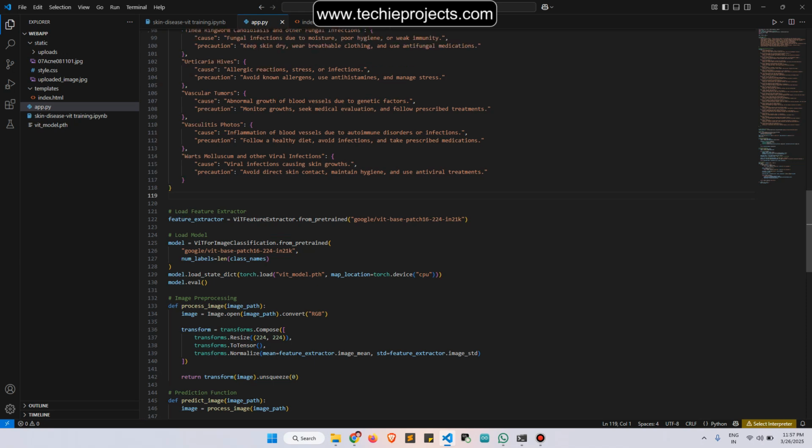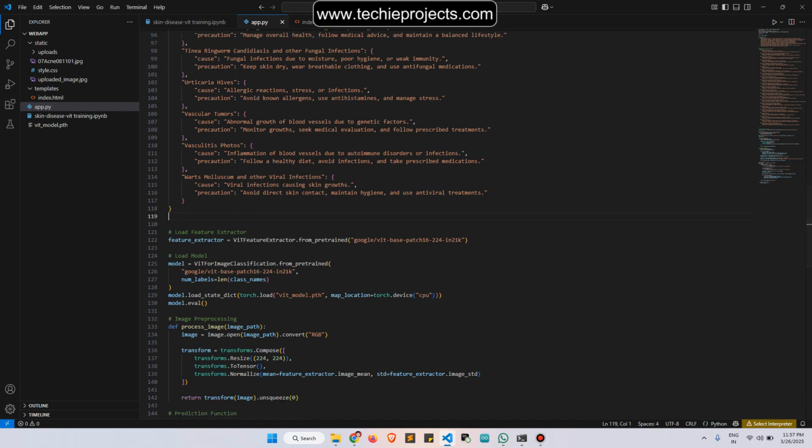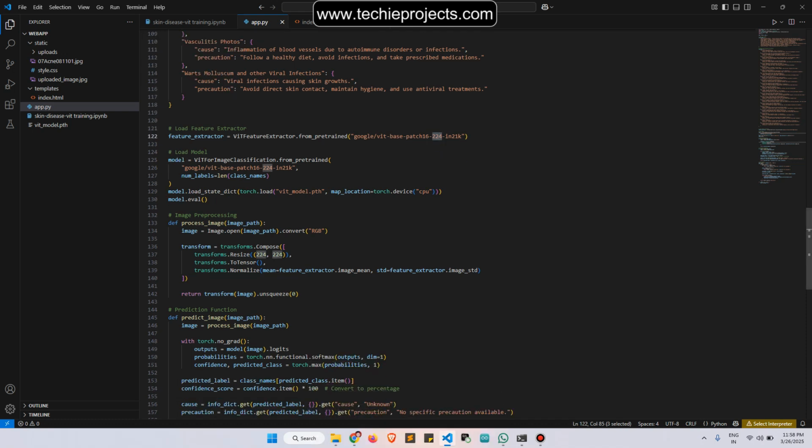All the cats will have similar face features, and all the dogs will have similar face features. So we extract features for that, and that is what this model is for. This model will be the same. Then the actual model will be loaded, and we give our trained model, because most of the layers are similar and just the last layers are different. So with this model we gave our model.